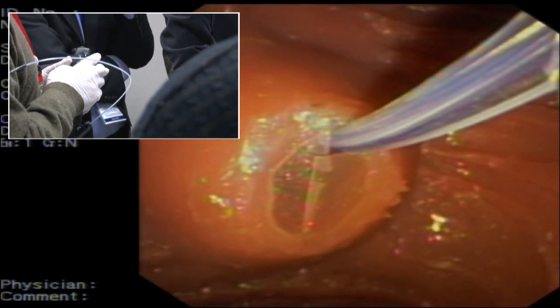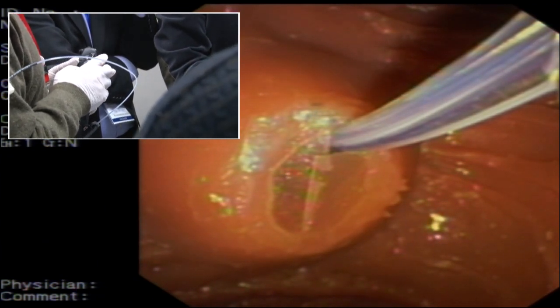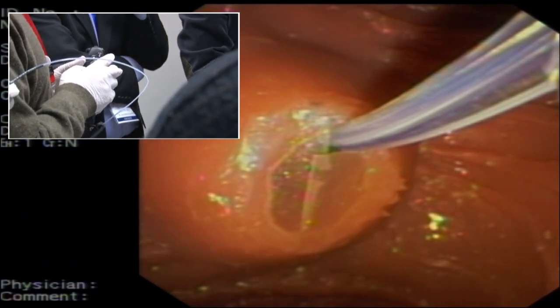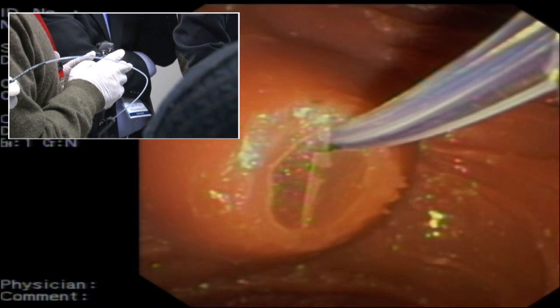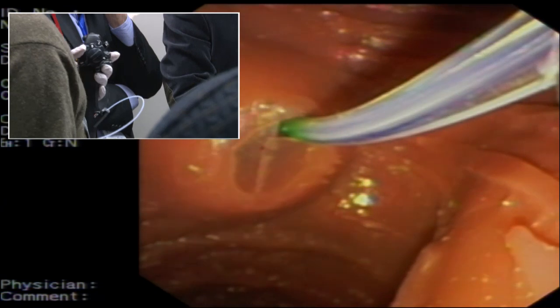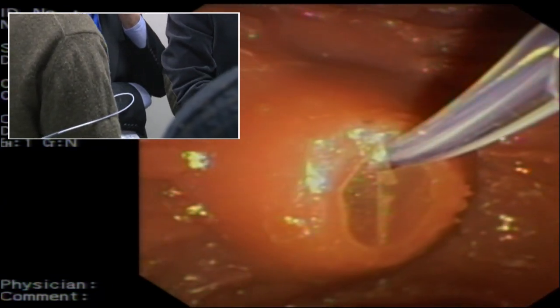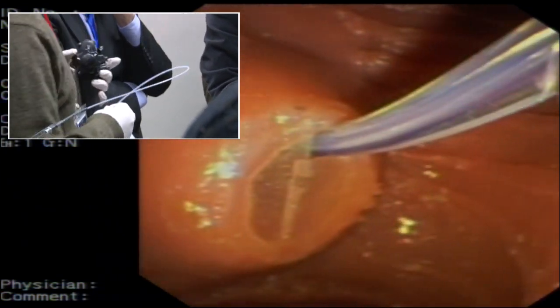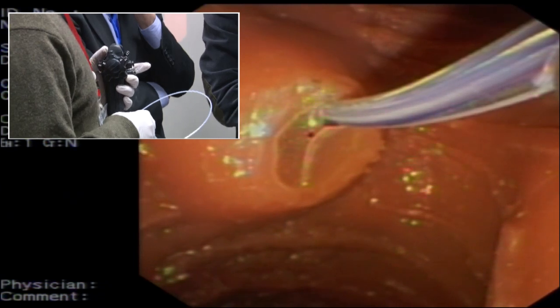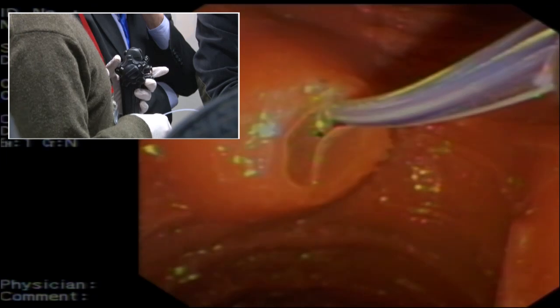Nothing changes except that you're using the combination rather than quite often just using this, which pushes your scope. Once you've got your scope in the right position, just turning one way or the other with the shoulder, now the other way, will also push your cannula in a little bit. So you have another way of doing it. So you have multiple limited movements, but different combinations can be used for different patients and needs.